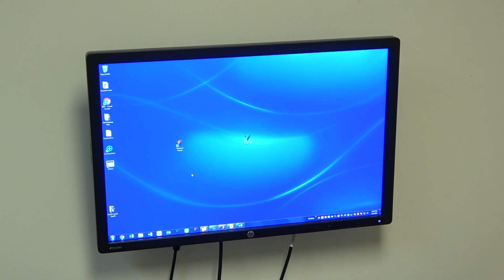When it comes to the one portion where it asks what you're going to be loading, it's got the viewer. It's also got the acquisition. It selects the panel and everything else. When you set up the original one, you would uncheck everything except for the viewer, and then you would simply install it as normal.